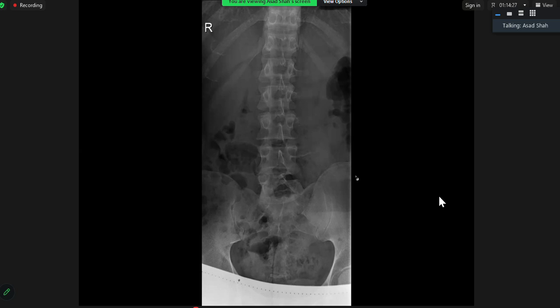Okay, so before I show you the lateral X-ray, in a 40-year-old, you have detected an abnormality and described it. What's your thinking? What's the differential diagnosis here? Absent left pedicle. There may be huge differentials. It could be mets, primary malignant. There are only 2 or 3 differentials, right? Could it be congenital? That will be the first question we always have to think about, isn't it?